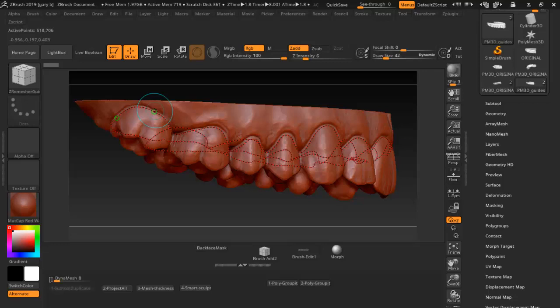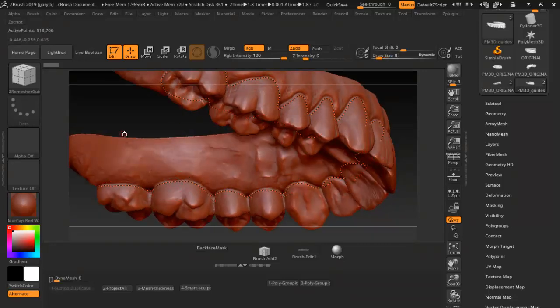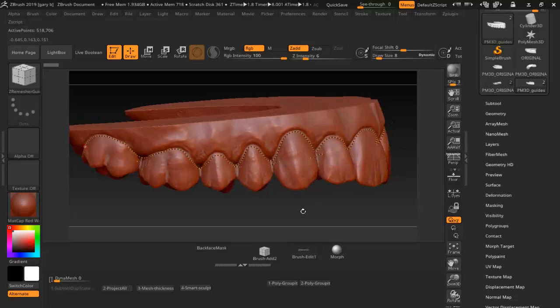If by any chance there was a break in the line, part of it would be red and part of it would be yellow. Alright, it'll be two different colors. Make sure it connects at the end too. Very important, or this will probably not work at all. Alright, like I said, I got fairly accurate.